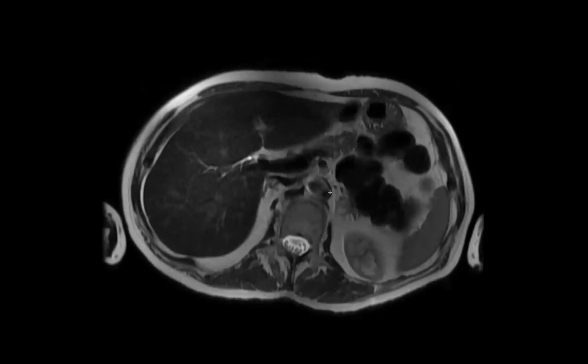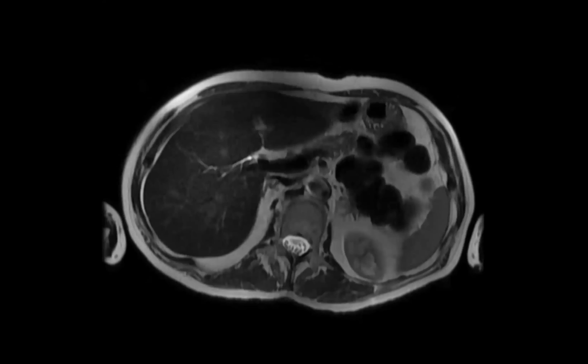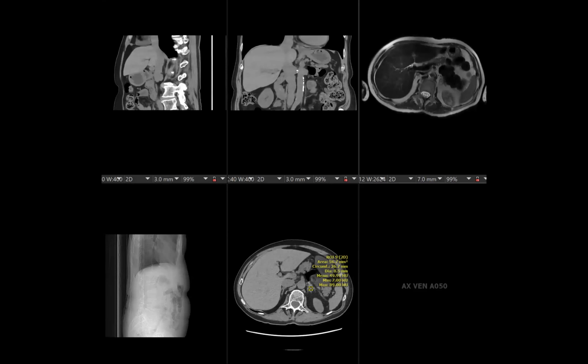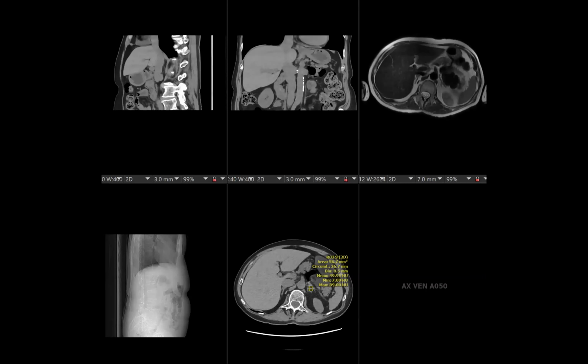Yes. So here are some MR imaging features. Oh, sorry, so that we got an MR. So this is the T2 on MR. There's no intralesional fat, and it's T2 bright. It is T2 bright, actually. Look at that. The urine analysis was negative for pheo.